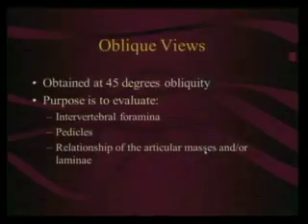Now, remember when we were talking earlier, and I said on the swimmer's view, you can't see the posterior elements of the lower vertebral bodies because the humeral head's in the way? Guess where you're going to see them? You're going to see them on these.